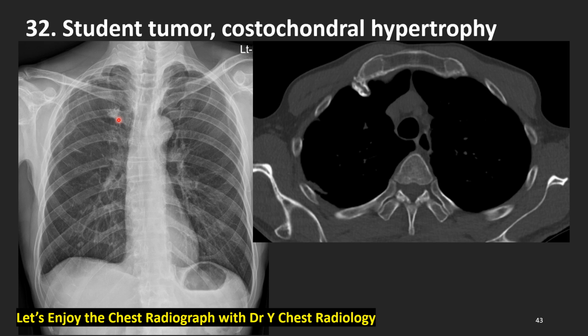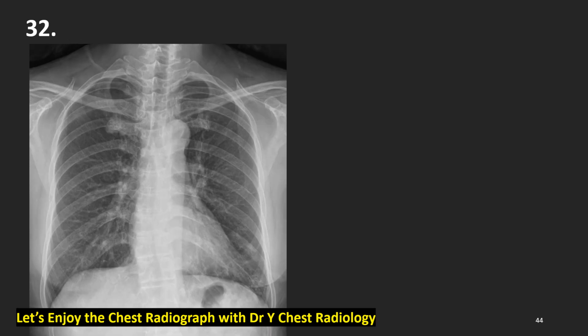The origin came like this. A naive medical student said to the radiology professor, "Sir, that is a tumor. There is a tumor." So the teacher said, "That's a student tumor, not a real tumor." Isn't this interesting? Look at this. Another student tumor of an old woman. It looks like a real nodule, isn't it?